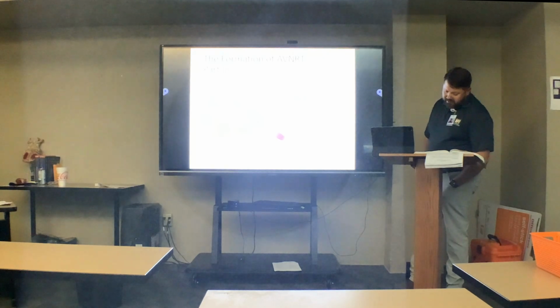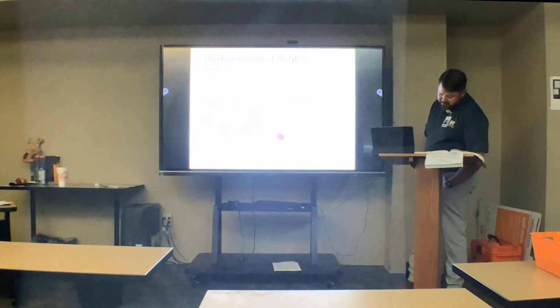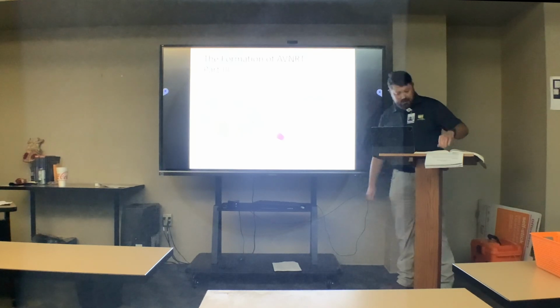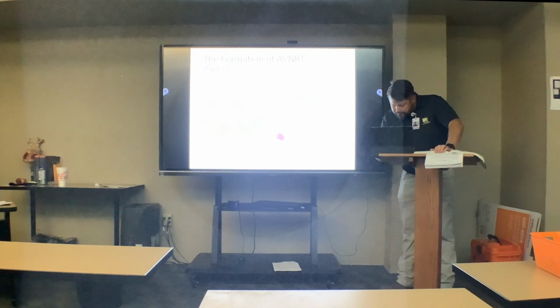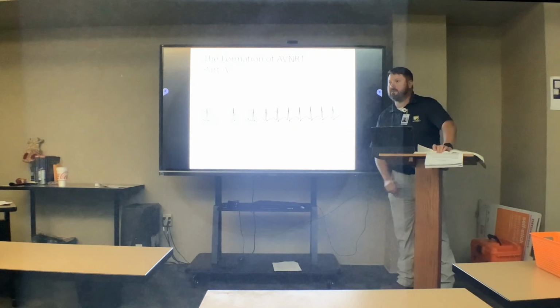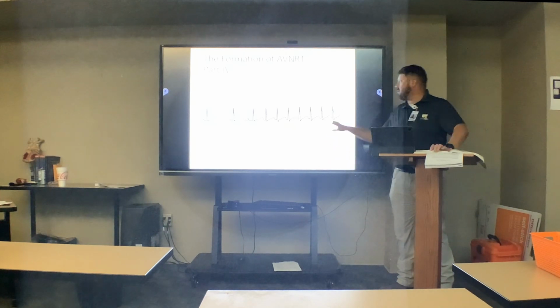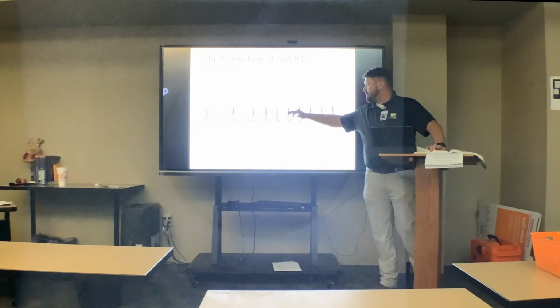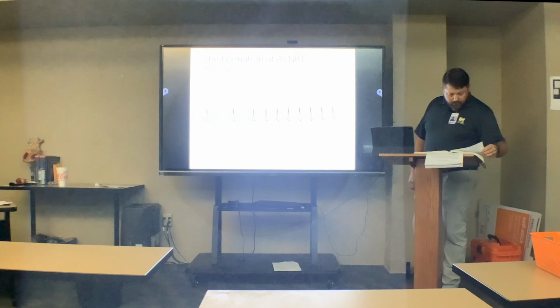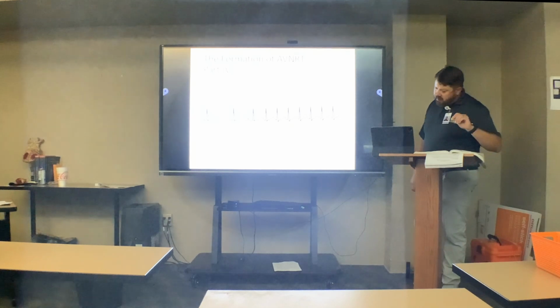And you may not always see that. As a matter of fact, you really don't see it very well in this example right here. I wouldn't expect you to see that. If you see that and you say, hey, that just looks like a sharp S wave, I'm going to say, okay, that looks like a sharp S wave to me too. What I'm looking at is the fact that you've got a fast complex, okay?